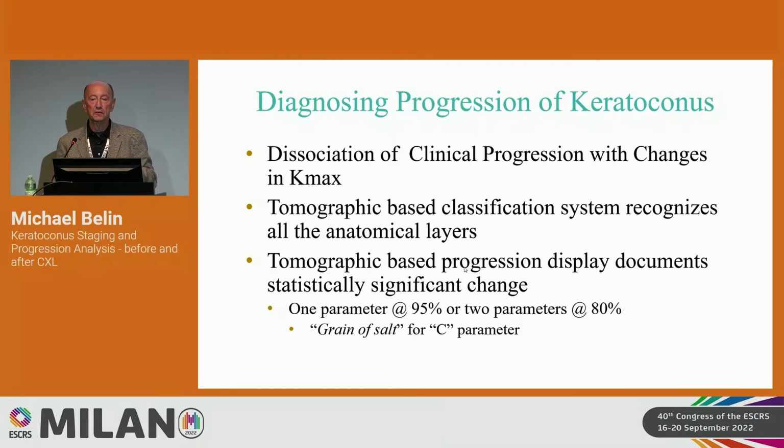It means I consider it, and the measurements were reliable, but like IOP, there's some diurnal variation in corneal thickness. And when we do noise measurements, we're doing it at the same time on the patient. So I just want you to take a grain of salt on the C parameter. If the only thing I saw was a change in the C parameter, I would still follow that patient.